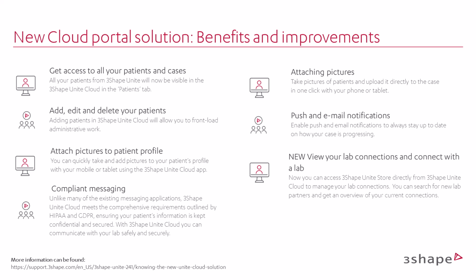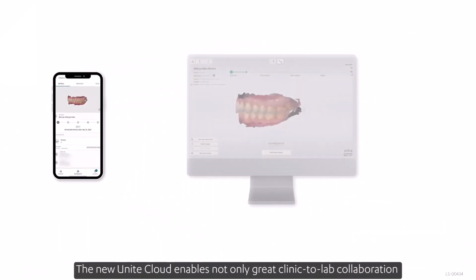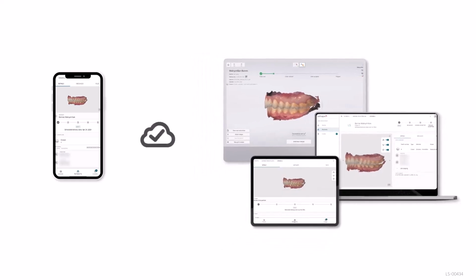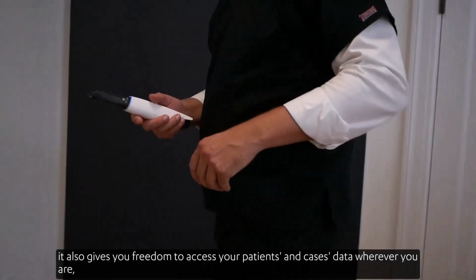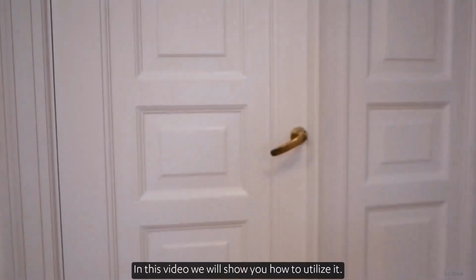Secure communication: unlike many existing messaging applications, 3Shape Unite Cloud meets the comprehensive requirements outlined by HIPAA and GDPR, ensuring patient information remains confidential and secure. Communicate with your lab safely and securely. The new Unite Cloud enables not only great clinic-to-lab collaboration and data synchronization between Unite on desktop and the Unite Cloud app, it also gives you freedom to access your patients' and cases data wherever you are, even outside the clinic. In this video, we'll show you how to utilize it.